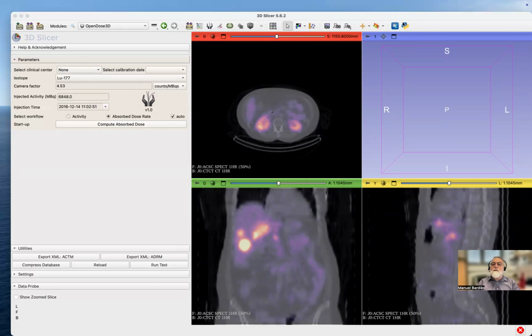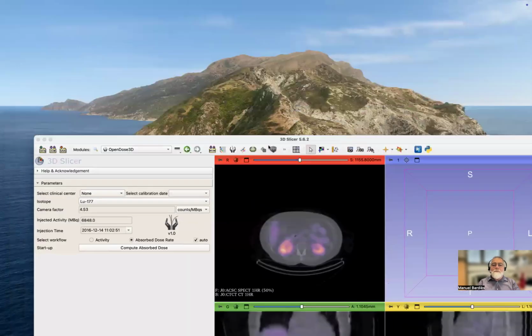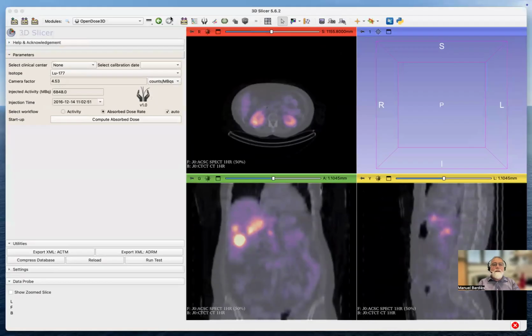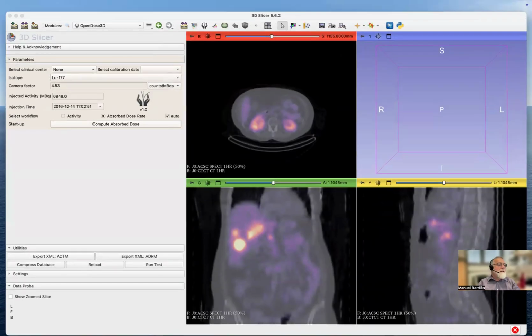But it's not so easy because, as you see, the wheel is spinning here. By clicking on the image, I could have made the bar disappear, so I'm going to put it back here. You can see that it's advancing. Okay, it's here. As you can see, it's advancing, and I'm going to get myself a coffee. So I'll see you in a couple of minutes.